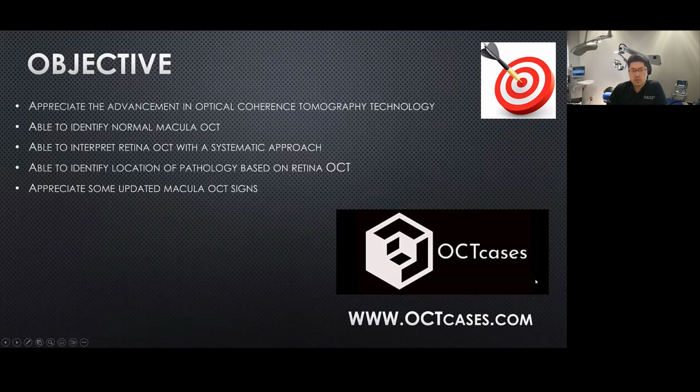The objective of today's education is to appreciate the advancements of optical coherence tomography technology and how dependent we are on it on a day-to-day basis, especially in a busy retina clinic, and to be able to identify normal in order to diagnose pathology. Also, as we all know, not all the time do we know the diagnosis. So being able to interpret retina OCT and isolate the location of pathology will often help you narrow down your diagnosis or differential diagnosis. And of course, to appreciate some of the updated macular OCT signs.